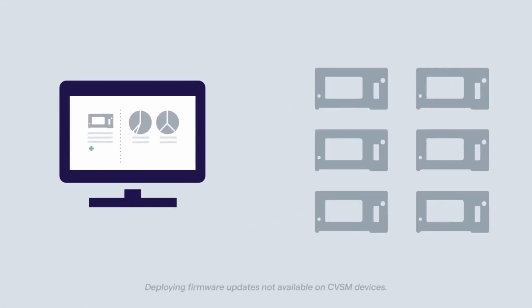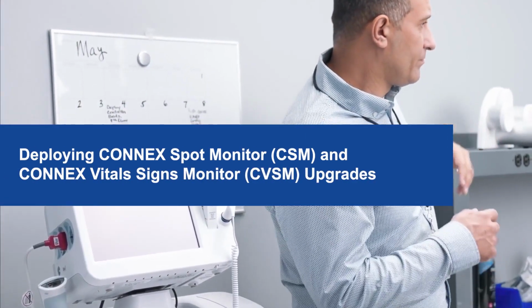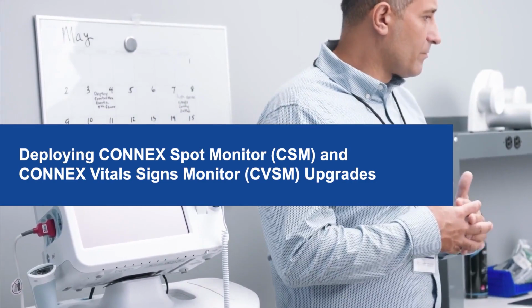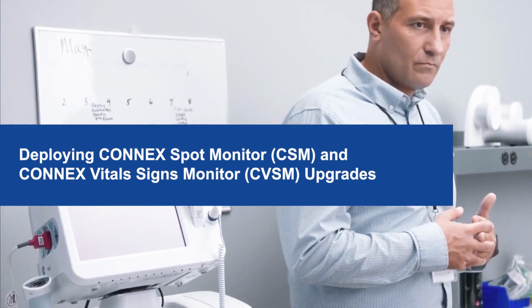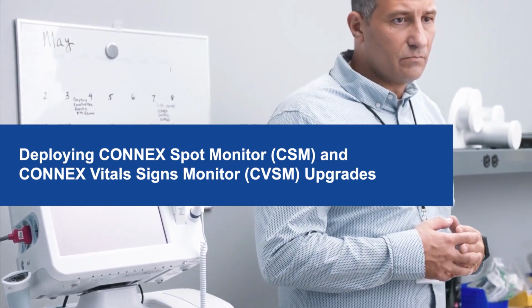This platform enables you to remotely deploy firmware updates to CSM and configuration files to CVSM and CSM. Let's take a look at how that process works for CSM and CVSM. When rolling out these types of changes, we recommend you take the following steps.